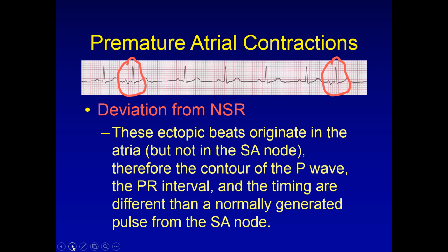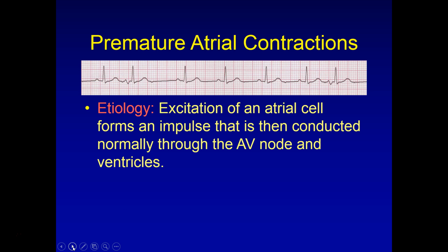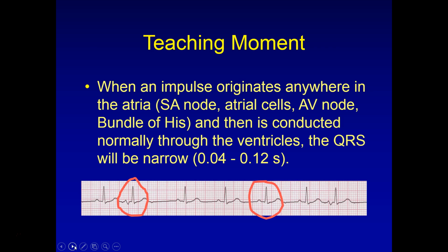And these are just ectopic beats that occur within the atrium, not originated from the sinus node, but still the atrium. But they did, however, send the electrical conduction down the normal pathway. Okay, and when looking at that, you can see that, look at this slide, the QRS has remained within normal limits. They stayed within 1 to 3 boxes. So despite the fact that the atrium contracted, caused an impulse that made it contract too soon, the ventricle couldn't tell the difference. It remained normal. So you did not lose any cardiac output because you're from the ventricle side.